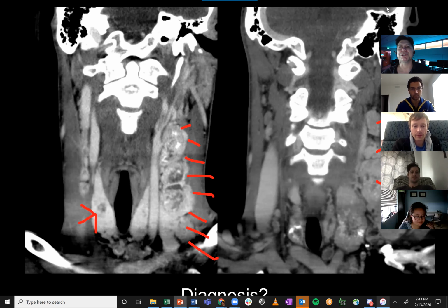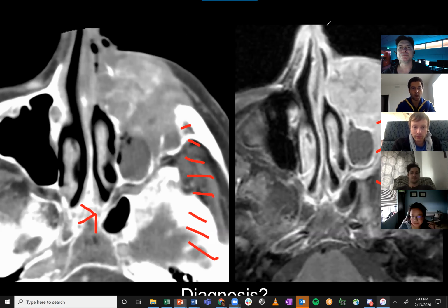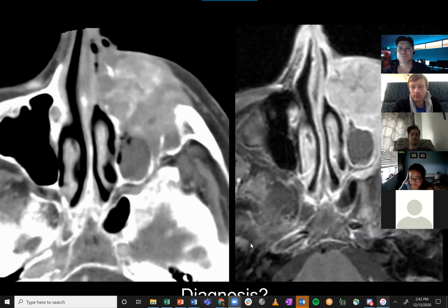Good. Okay, next case. All right, next up we have Amin from UCSD, who's a 4th year. Okay, Amin. Okay, hello. Hey. So we have an axial post-contrast CT, and then we have an axial post-contrast fat-sat MRI.